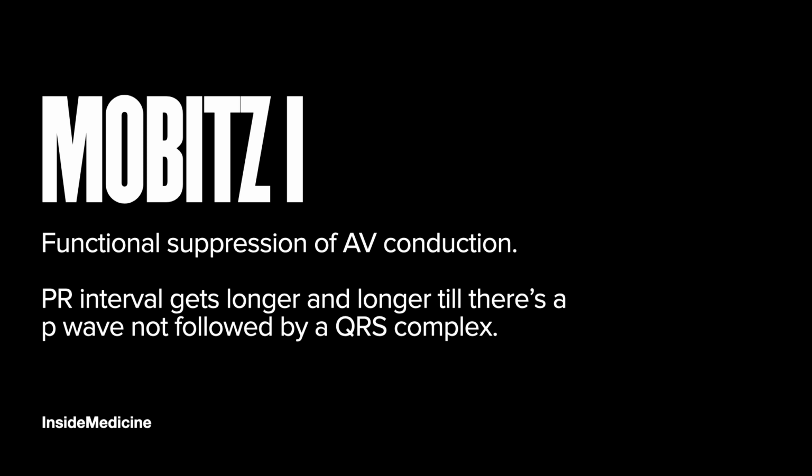Time for second degree heart block. This is broken down into 2 subtypes: Mobitz 1, also known as Wenckebach, and Mobitz 2. In Mobitz 1, we see a functional suppression of the AV node. The PR interval will get longer and longer, and then we have a P wave but no QRS complex.